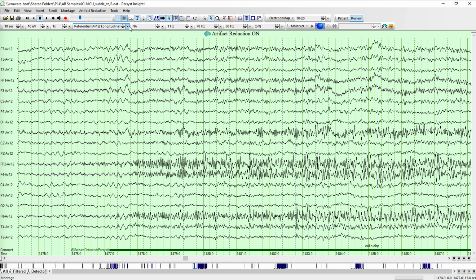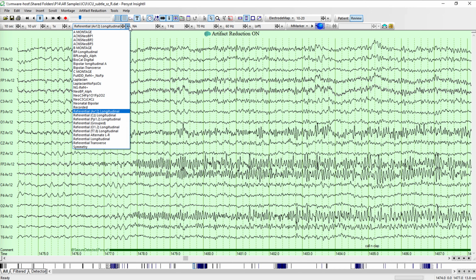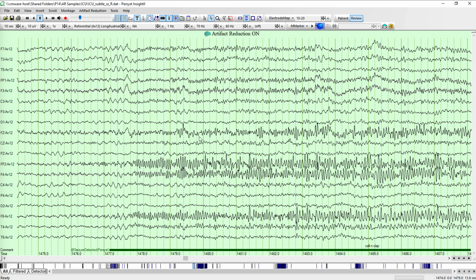And so the first step is to pick an appropriate reference. And whether that's a Laplacian, which tends to localize things a bit tighter, or an average reference, which is probably going to be your go-to for most mapping applications. So we can see from the EEG what's happening here. No mystery there. But mapping provides another way of representing that.